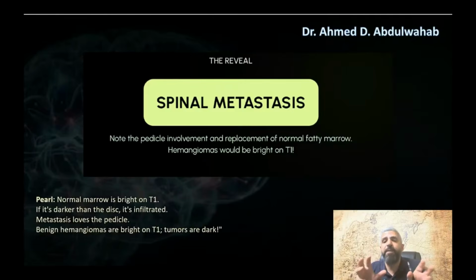Metastases love the pedicle. There is a love story between metastasis and the vertebral pedicles. Keep in mind that benign hemangiomas are bright on T1. Tumors are dark. So, hemangioma bright on T1, tumors are dark.